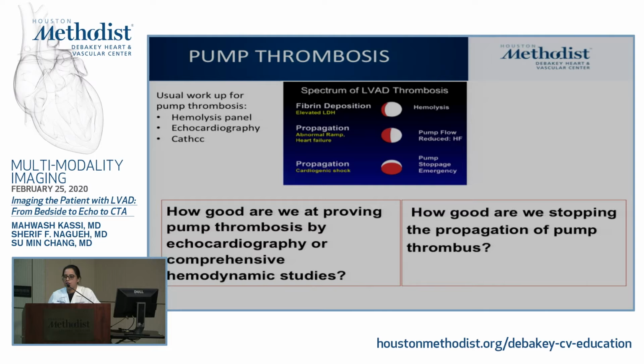And I've never seen a clot that we can see by echocardiography, nor by CT scan, because most of these clots are within the rotor and you cannot see within the rotor itself. One other important thing to realize is that pump thrombosis, even when it starts, goes through different phases. So it could be a phase of fibrin deposition, then a phase of propagation, and then a phase where it completely occludes the pump.